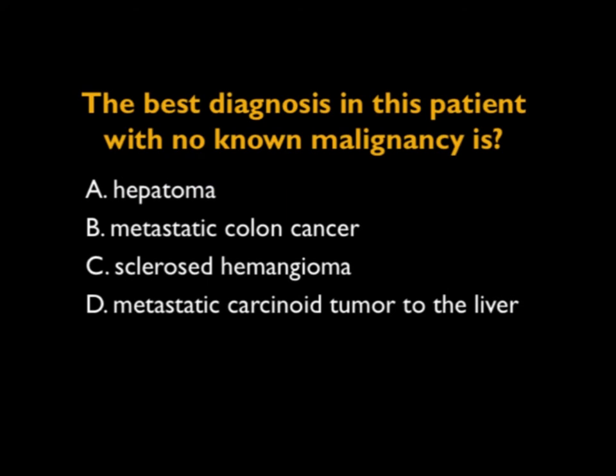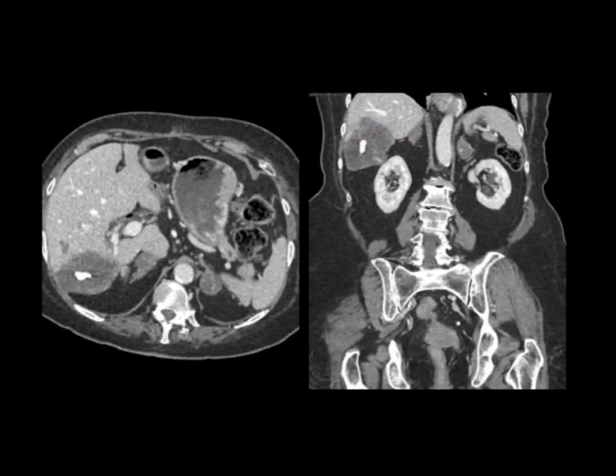In this case, I'm showing you a mass in the liver, and what's unusual about this mass is its low density, which is not really unusual, but the dense central calcifications. Now, of course, if I see a mass with calcification, I do think about mucinous adenocarcinoma metastatic to liver, but it's more of a spotty, ill-defined calcification. You can see calcifications occasionally in some neuroendocrine tumors, and you can see calcifications, usually dystrophic calcifications, in a patient with hepatoma. But this liver is not cirrhotic, so it's unlikely to be hepatoma.